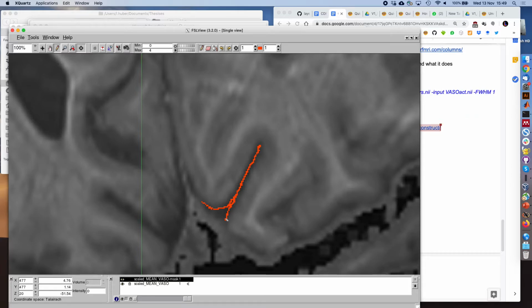Now, where do you want to draw your ROIs? Usually, you want to draw your borderlines. A voxel that's half filled with gray matter, half white matter is the borderline, right? Same with CSF, the voxel that determines the borderline or the position is at the border where it's half filled with gray matter, half filled with CSF.